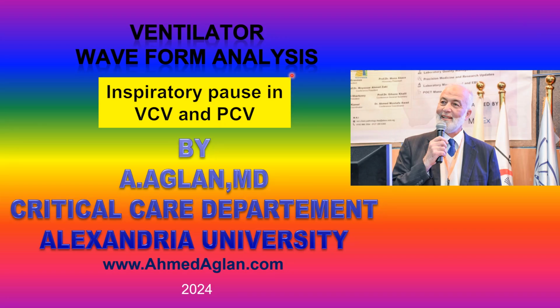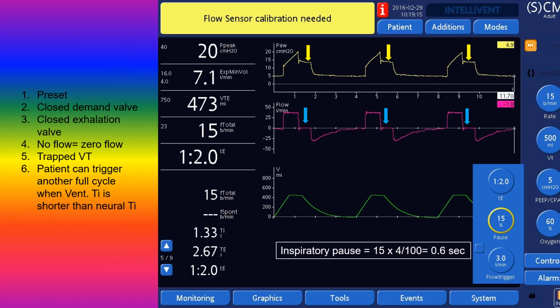Ventilator waveform analysis. Inspiratory pause in volume controlled ventilation and pressure controlled ventilation. What is the difference between the two? This is an inspiratory pause in volume controlled ventilation. It is preset.